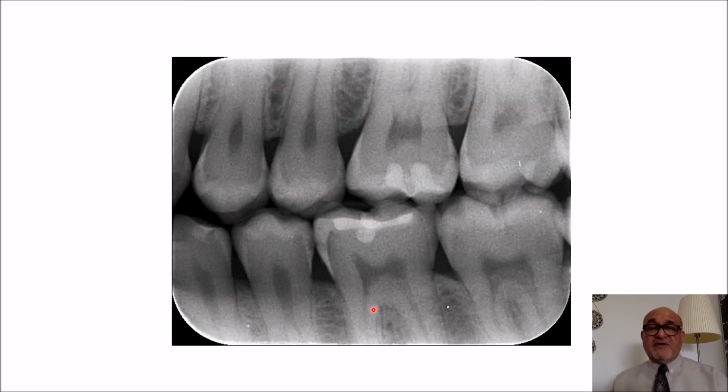Another radiograph over here. Correctly placed? Yes. Occlusal plane is right. This is the mandible with its typical horizontal direction and the teeth. And this is the maxilla with its typical direction of the bone trabecules. The roots here do not always show, because this radiograph is meant only for the crowns.